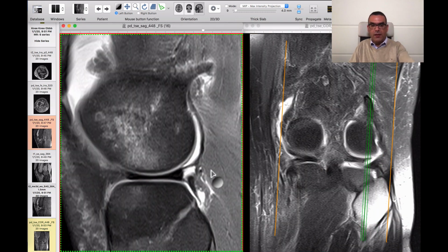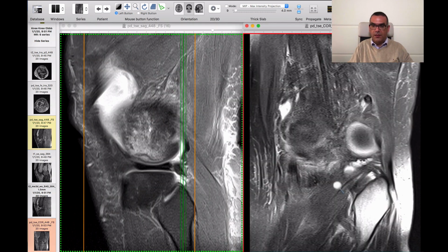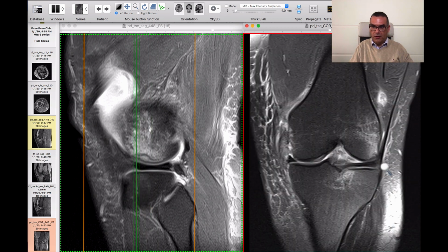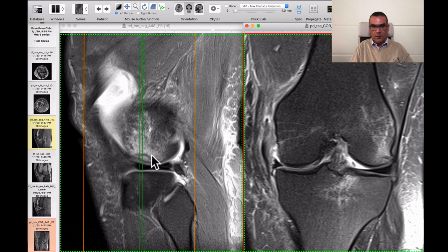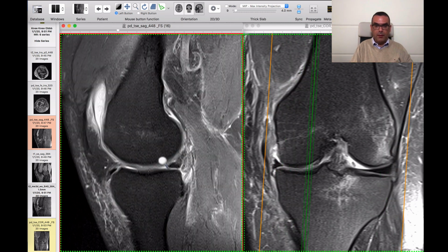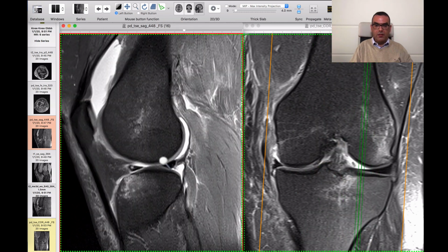The fibular head looks intact. You have the marrow contusion at the lateral femoral condyle. There is an obvious subchondral trabecular compression fracture, just as we saw in the last case. The subchondral bone shows a sclerotic compressed line at the lateral femoral condyle, and there are similar smaller marrow edema changes seen at the anterior aspect of the lateral tibial plateau.